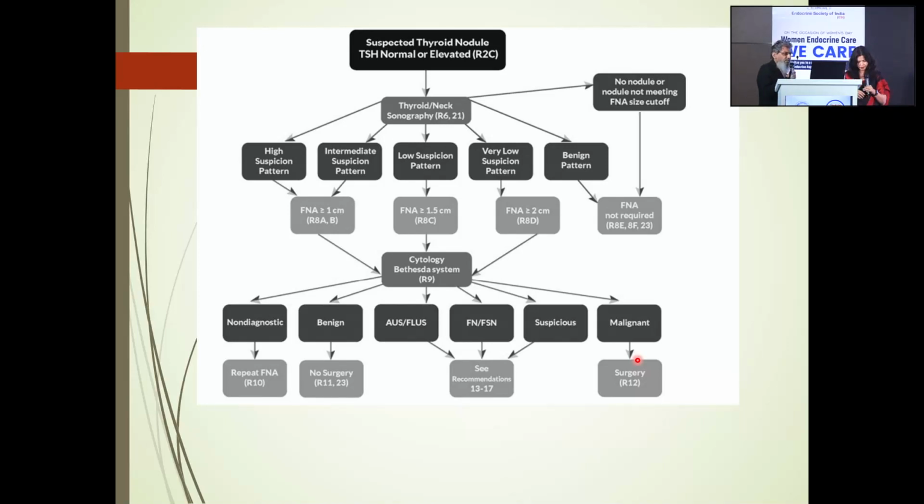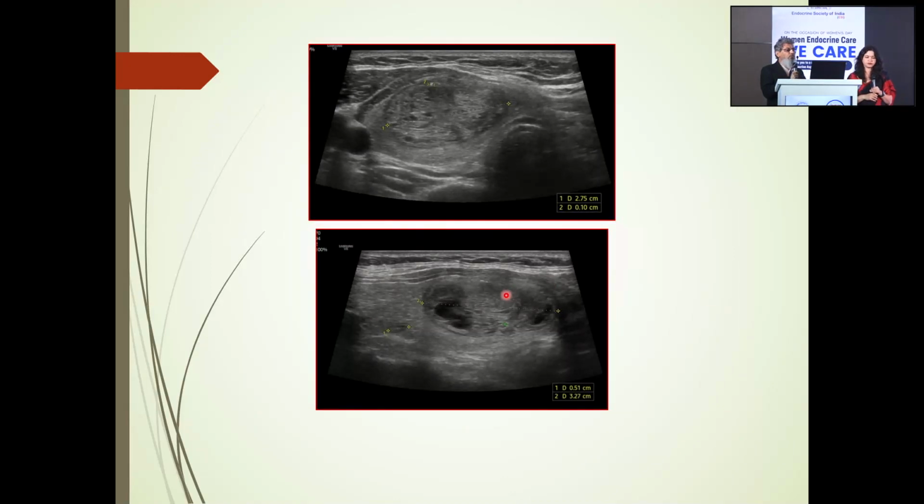Yeah, I think so. It makes simple sense, because there is a very good chance that amongst the nodules you are likely to pick up, this was one nodule which looks quite benign, but we had to do FNAC. Then we would choose a certain area. Amongst that nodule was the most hypoechoic area which looked solid, and believe me, this was papillary cancer. So it becomes important that the radiologist uses his discretion while doing the FNAC, about where to do it from, and simple tools like a little bit of hardness or something can help them. So this was one important message here.